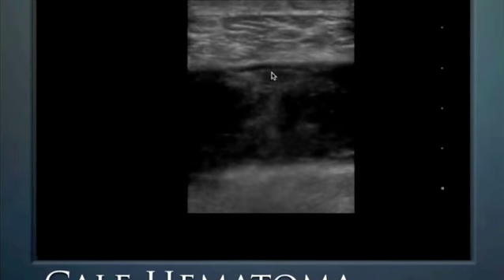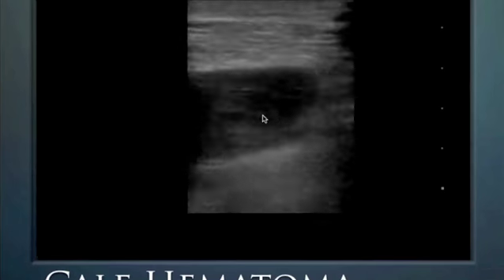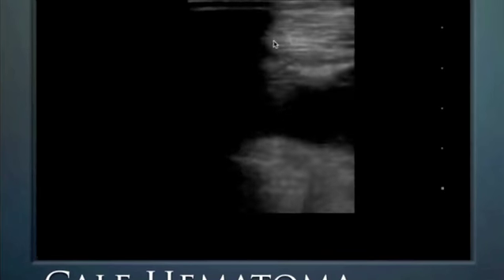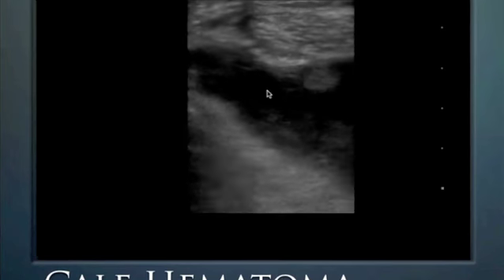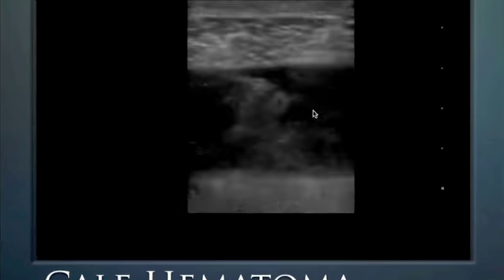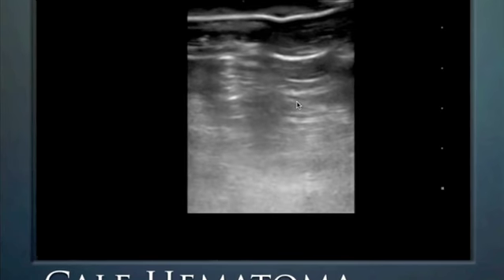And finally, some things look like abscess, but they're just hematomas. And that's what this looks like here. This is in the patient's calf. This is muscle we see up here, and this very hypoechoic area with some anechoic areas to it. This is what a calf hematoma looks like. It's all spreading out back here. And on the patient's skin, too, there's prominent ecchymoses seen as well.